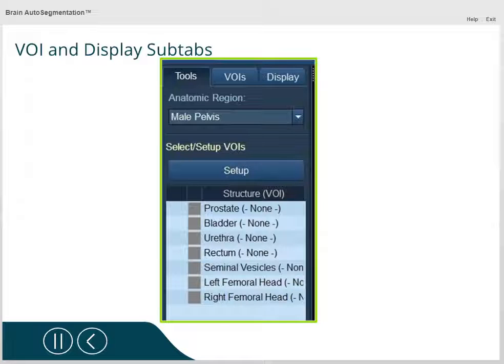They work exactly as we have described during previous modules: head and neck and prostate auto-segmentation, contouring and/or visualization e-learning modules. Alternatively, rather than choosing to change a subtab, you can use the right mouse click functionality option to zoom the image to view the results, or select the axial side-by-side layout, which will allow you to observe the results on both the MR with the CT side by side.